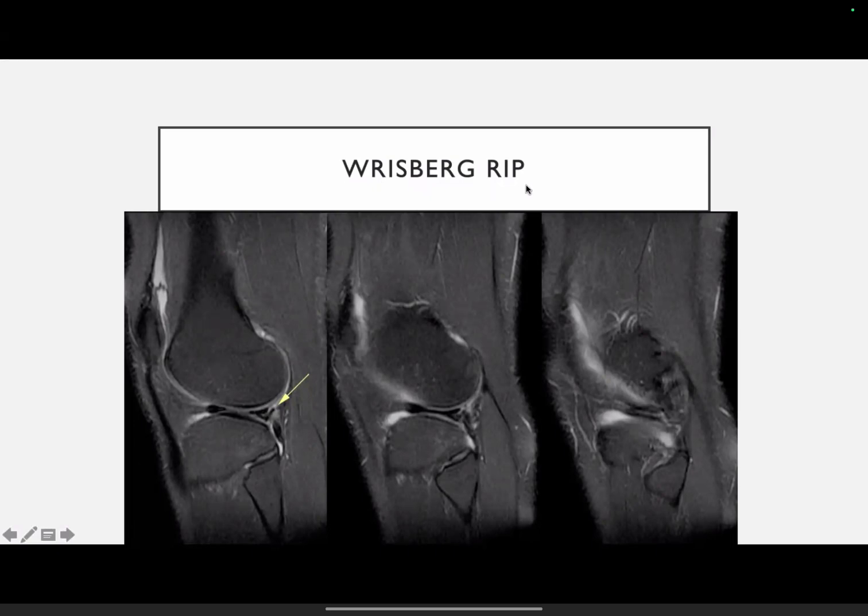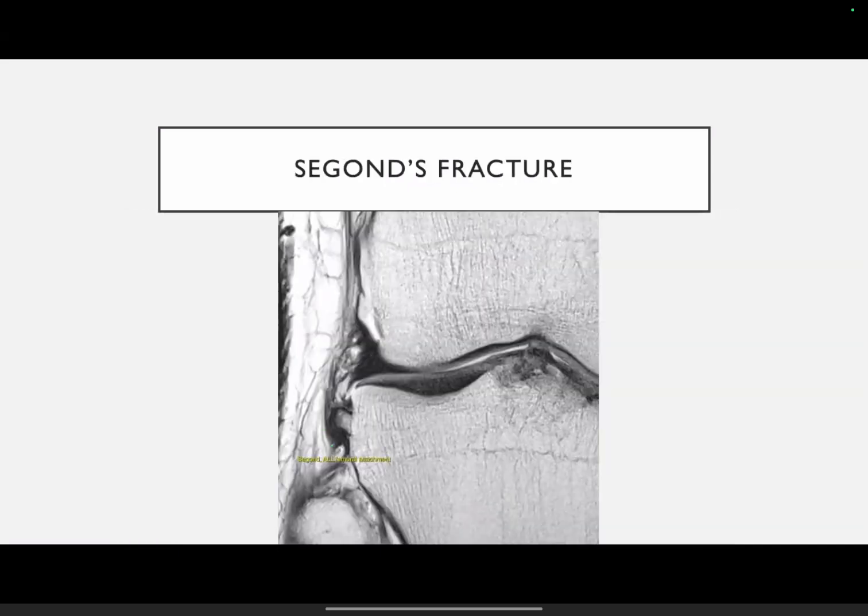So these are important areas which the surgeon would address. He knows that these are the conditions involved along with the ACL injury, and he would go and repair them along. So this was a translational bone marrow edema pattern and associated things.